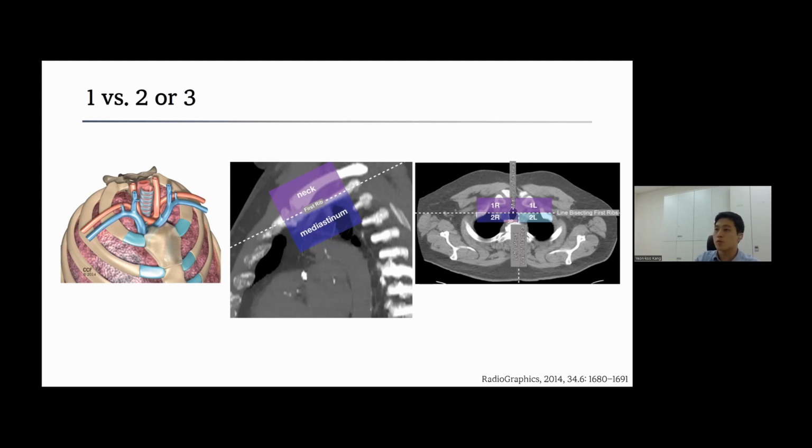First figure shows the thoracic inlet, a definitive anatomic boundary that exists between the neck and superior mediastinum. The anatomic landmarks of the thoracic inlet are the superior margin of the manubrium, the superior margins of the first ribs, and the T1 costovertebral junctions.